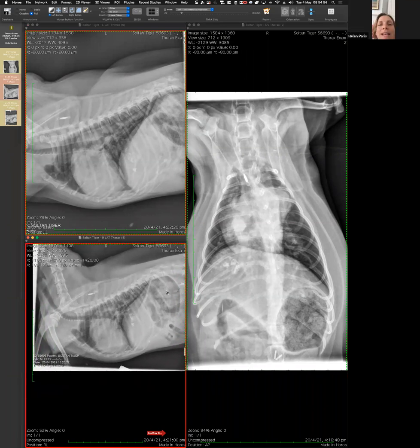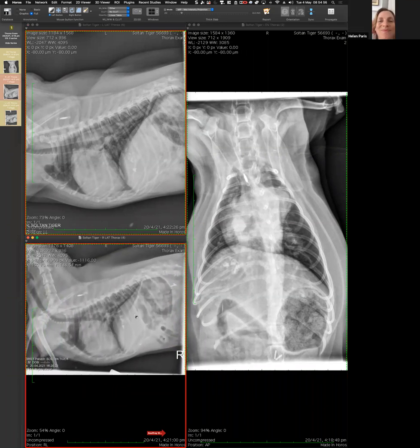Yeah, that would be good. My anatomy knowledge of that area is very poor. Well, it's a very complex area, and you will see that it's all about displacements. So it's where things sit, and if one thing gets enlarged, for example, in this case, one way to really drop the idea of lymph nodes is that the trachea and the principal bronchi are not displaced, and that's a hallmark if the lymph nodes get enlarged.